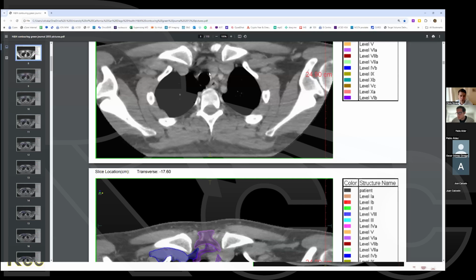For others, we often will go to the arch of the aorta, but including these mediastinal nodes is appropriate also for very advanced subglottic or hypopharyngeal cancers with significant nodal burden. It's also appropriate to go lower, but those again aren't formally part of the lower neck lymph nodes.